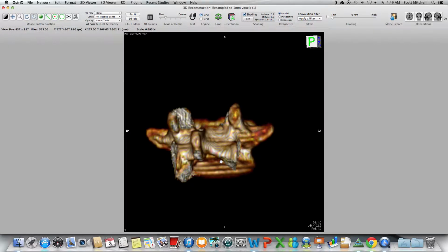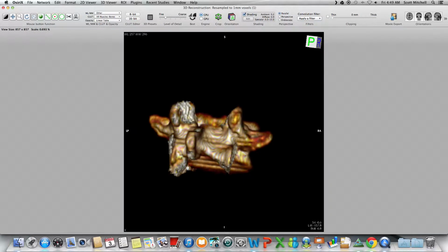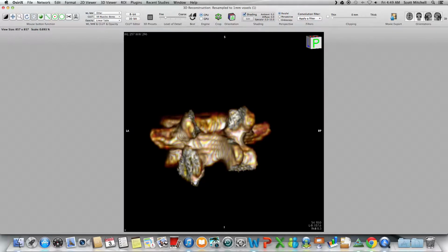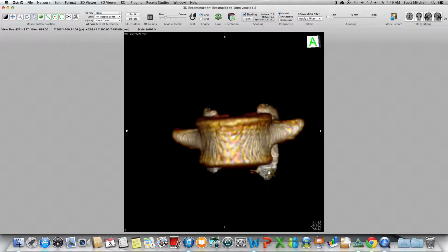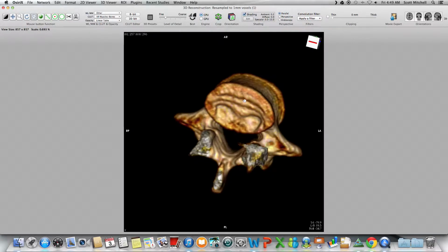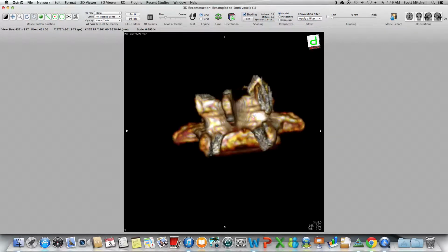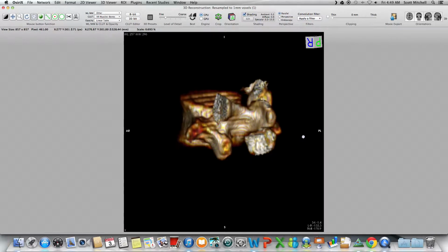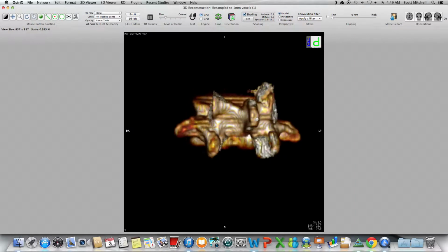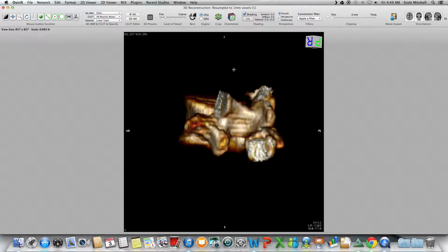So in the L5-S1 joint, it's a little difficult because everything's starting to fuse together. Kind of how the T12-L1 joint's a little odd. This one's unique in its own way. Let's try to cut some of this. Not sure if I'll be super successful.